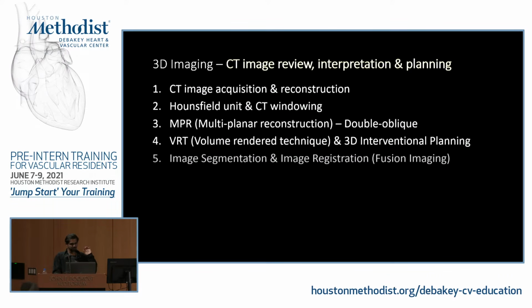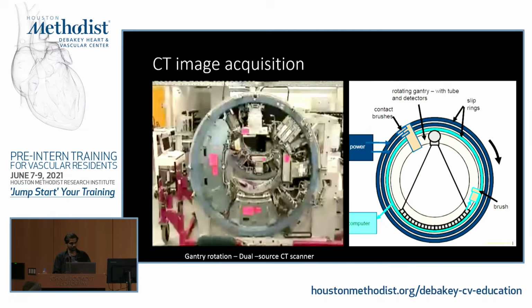So we're going to touch on 4, possibly if we have time, 5 main topics. I'm going to touch a little bit on how CT images are created, and we talk a little bit about CT Hounsfield units and multiplanar views. If there is one thing I want you to learn from today, it's multiplanar reconstruction. I want everyone in this room to transition or graduate today from looking at CT images in axials to how do we do that in multiplanar views, and hopefully I can convince you why we should do that. And then talk about some complex 3D volume rendering techniques and how we can use them for even open/endovascular planning. That's why I kept it as 3D interventional planning.